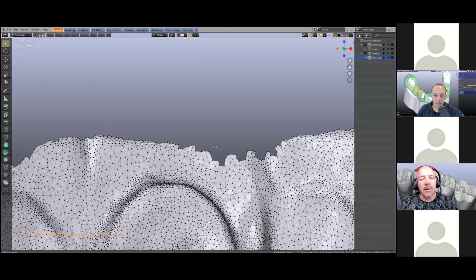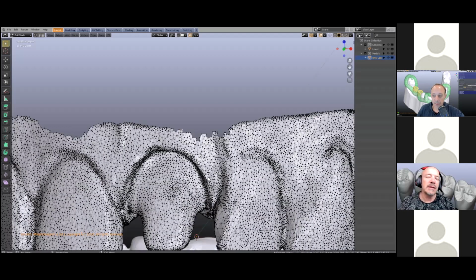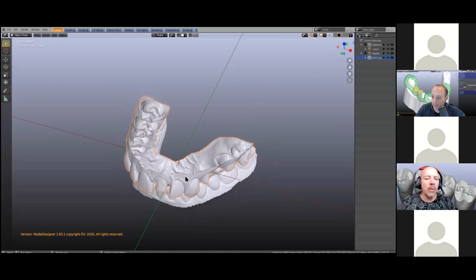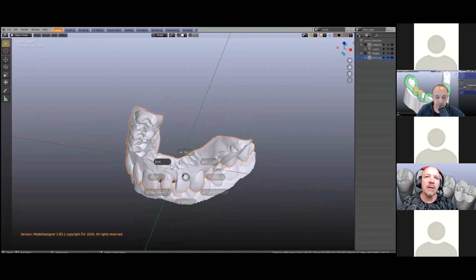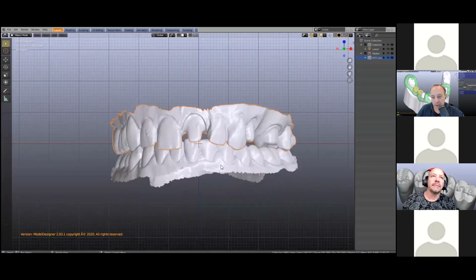All right, so we're going to now start putting this into the center of Blender. Now, Wolfgang, can you explain why we put these models into the center? Yeah, so when we're basing, for example, the extrusion of the actual base will go into a vertical direction. So imagine if you had the scans flipped the other way, the extrusion won't actually work.